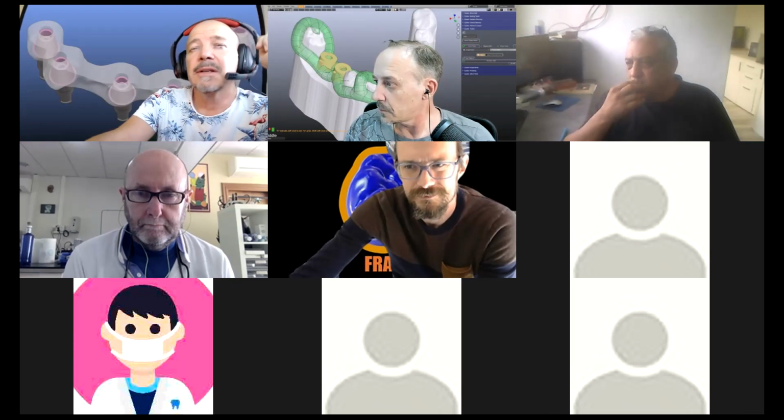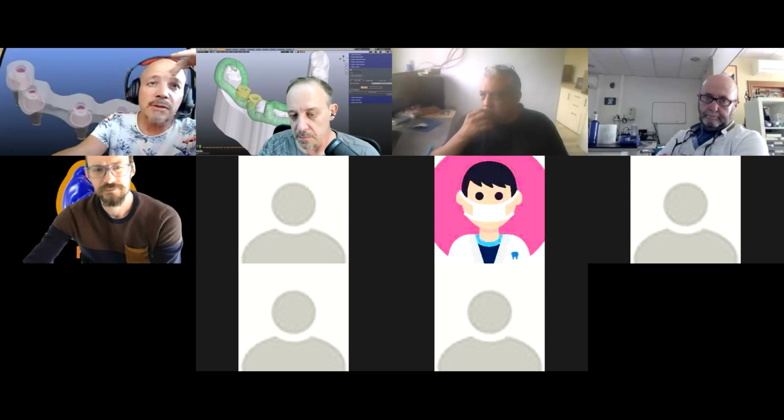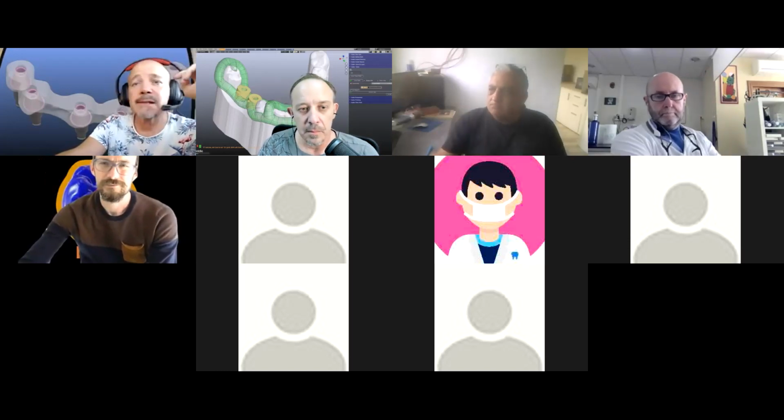And we had that last week. There were a few changes, and we appreciate this feedback because personally, to be honest, I've never milled a custom abutment myself digitally. So this is all new territory for me. I'm building from ground zero up, so we're going to see how this works. And this is a very, very difficult case to start with.